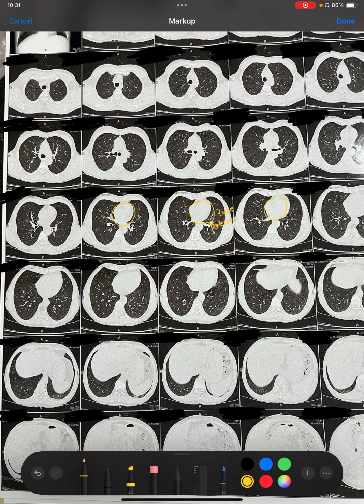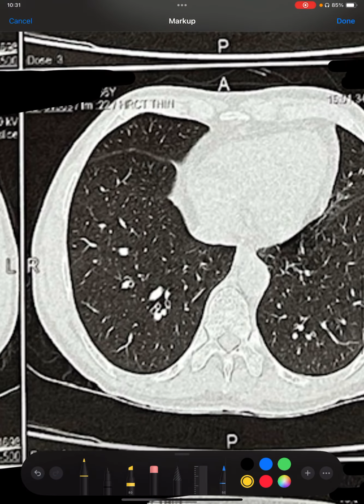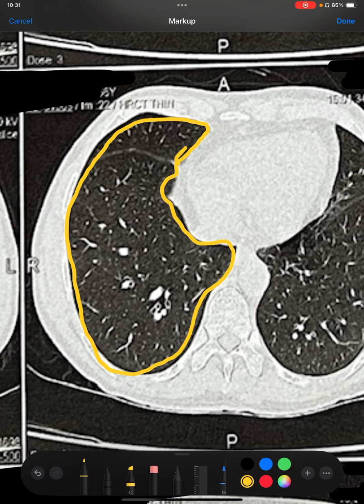The all radiolucent part, that is all lungs, which is right lung, this is left lung. So we need to see that this is right lung and this is all left lung which is there. Now whenever we are seeing the lungs, we need to see how the lungs are. So in the lungs, the most portion should be as radiolucent as this. There should not be significant white bands. There should not be any collection.